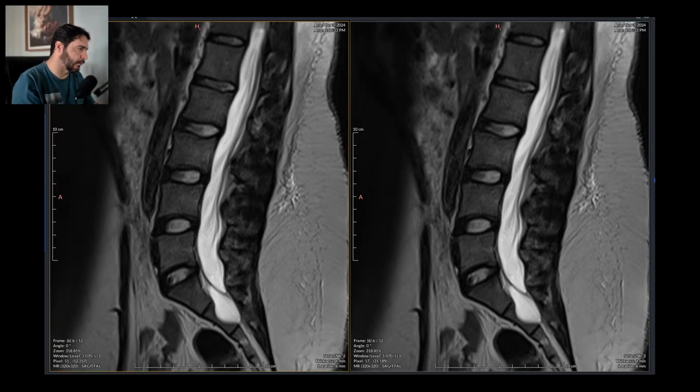Inside the sacral canal. So let's summarize. Mild arthrosis and synovitis of facet joints. Edema of the interspinal ligaments from L4 to S1. Just copy and paste and remove a few words because it's easier.